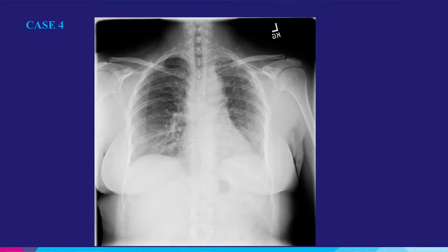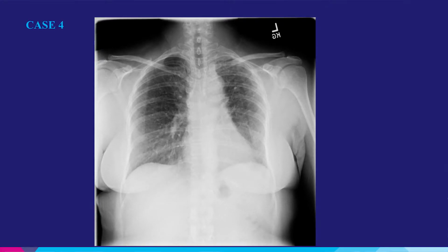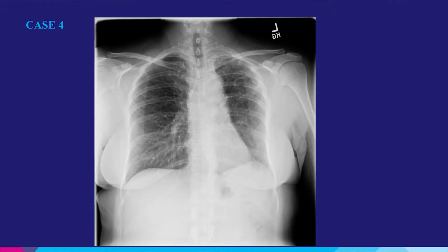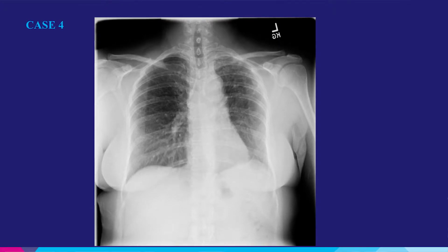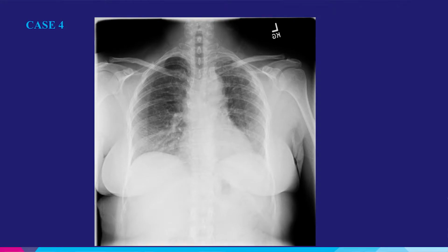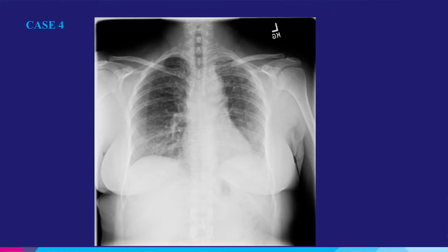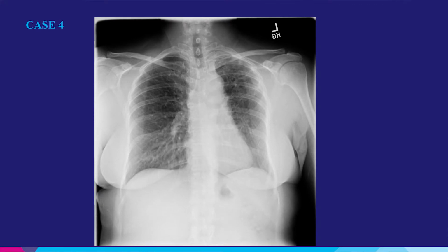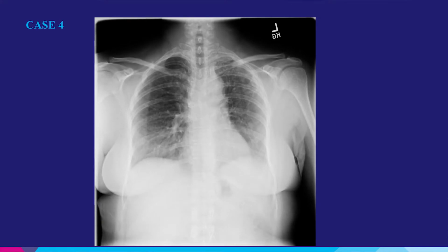If you don't mind playing it again, please. So during tidal breathing, there's good diaphragm excursion. I'm sorry, we'll play that again, if you don't mind. So right here, if you look at this part of the left hemidiaphragm, there's early, if you want to call it, early eventration of that left hemidiaphragm.